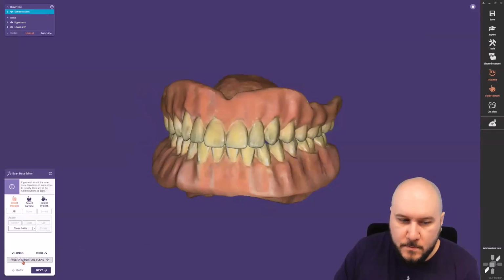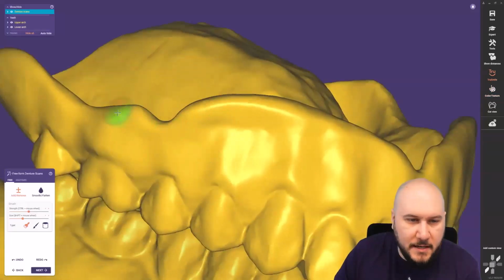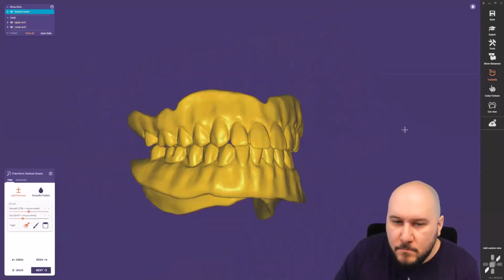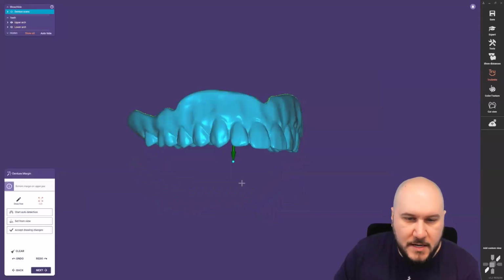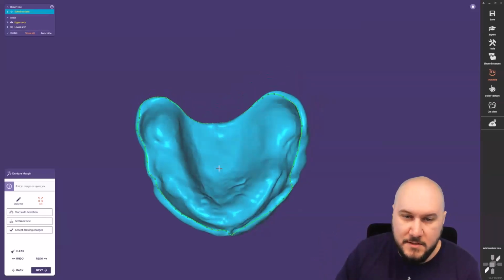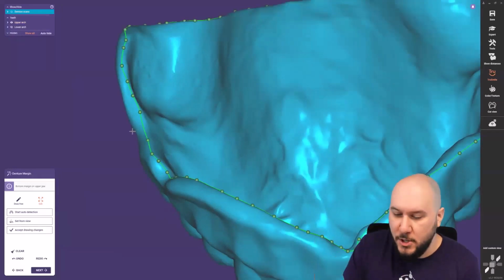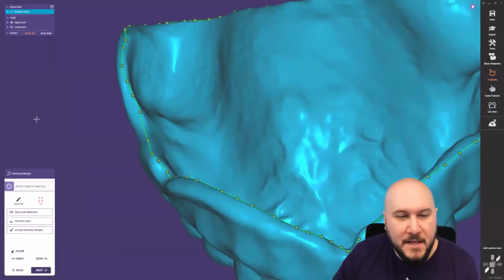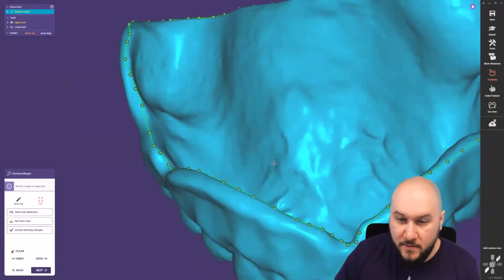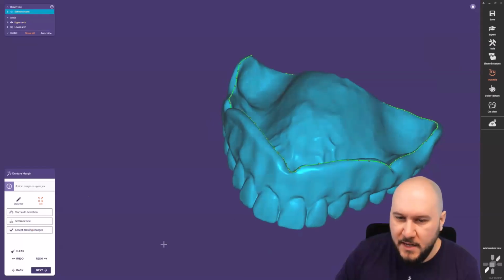Or you can also just click on it, and then I can see the color texture. And then I can, for example, freeform different kinds of things. Also the basal part here. You can just work with that. But now coming to our denture margin, the next step. The software algorithm is giving us here a suggestion. But like you see, when you know the margin line tool, it's exactly the same. The denture margins, I can add or remove pins here. I can also adjust them like whatever I want to with it. But I think I'm fine with that kind of margin stuff.